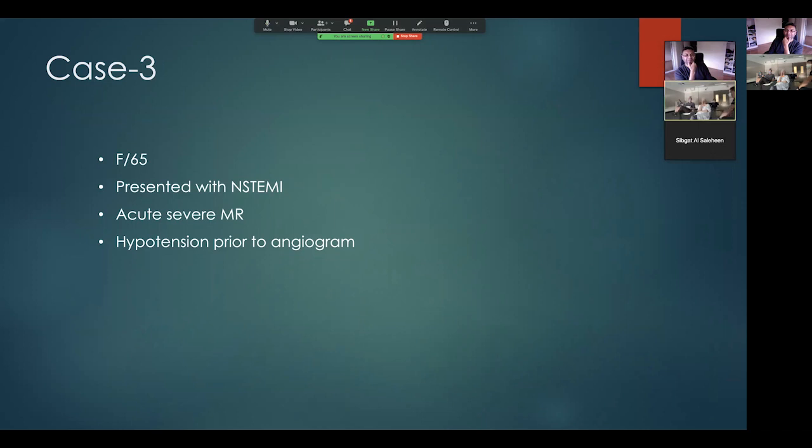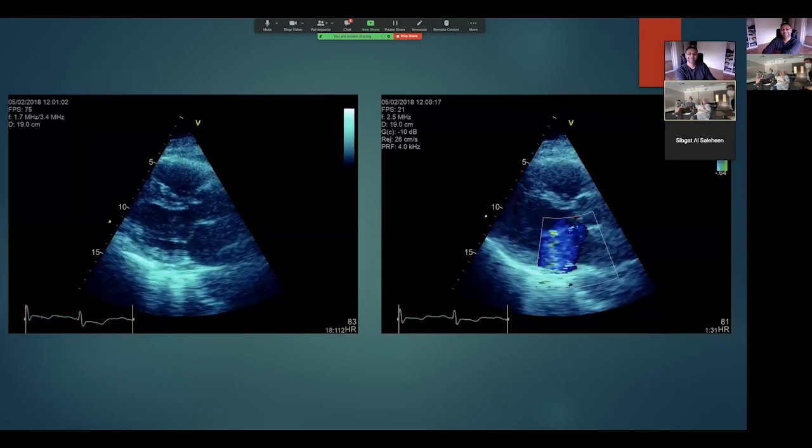So this is my favorite case ever, because this was maybe 3 years ago when our Echo Fellows were joining us. They were both people who had never been to the unit, and we had 2 Echo Fellows that year. They both come from quite prestigious units. On day one, they turned up, and this was our first case. Literally, I'm just showing them around, and then this lady has a Met call and comes to the unit, and it's an absolute cracker. I think they probably thought that everything was going to be like that for the rest of their time, but it obviously wasn't. But it's a good one for day one of an Echo Fellowship. Go for it.